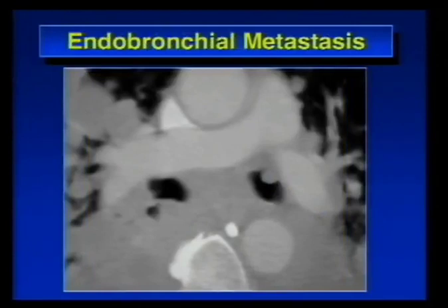Well, based on pathology. You can't tell on this image. Differential diagnosis: bronchogenic carcinoma, carcinoid, sometimes mucoepidermoid or adenoid cystic tumors can do this in the bronchus, or metastasis such as from what primary tumors? Melanoma, breast cancer, those are some of the more common ones.